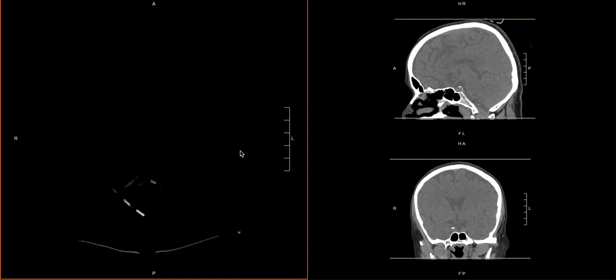Now that we're ready to go through our cross-sectional imaging, we're going to start with the soft tissue window and do our outside-in approach. What I like to do is have my axials on the left here. I use the soft tissue kernel. This particular series has a slightly thicker slice, 3.75, but you want medium thickness slices when you're looking at the soft tissues. And then here I have my sagittal and then my coronal just for co-localizing purposes.